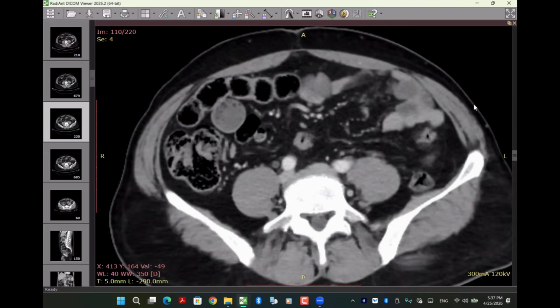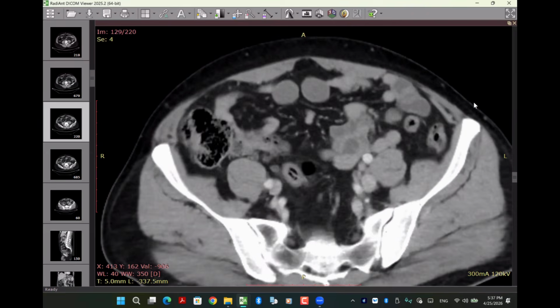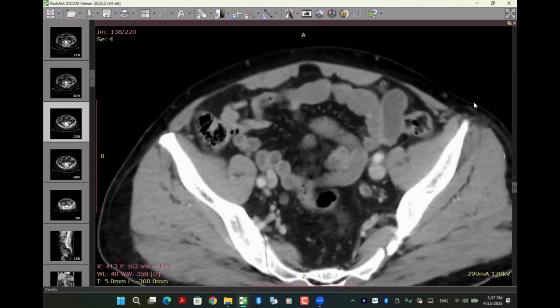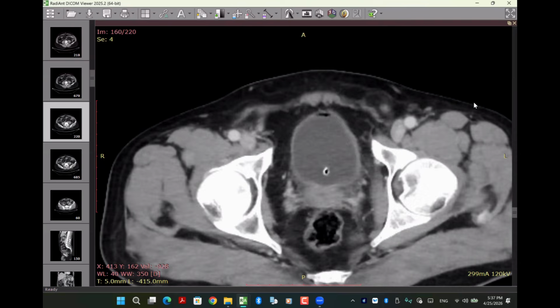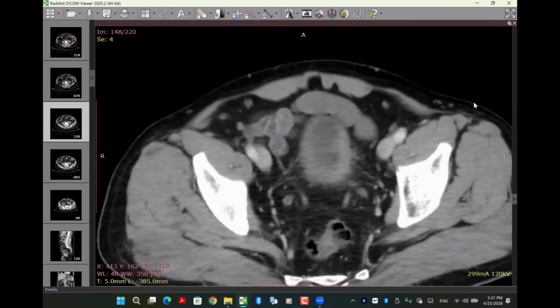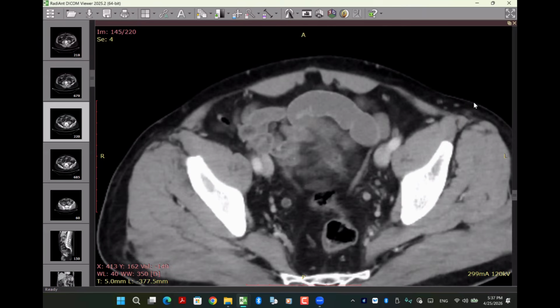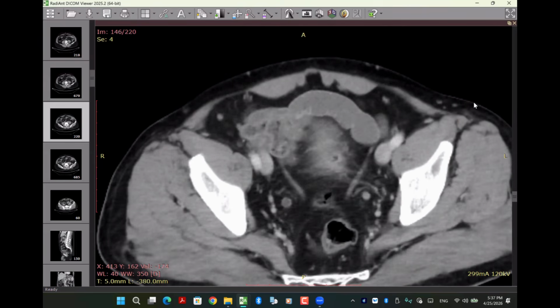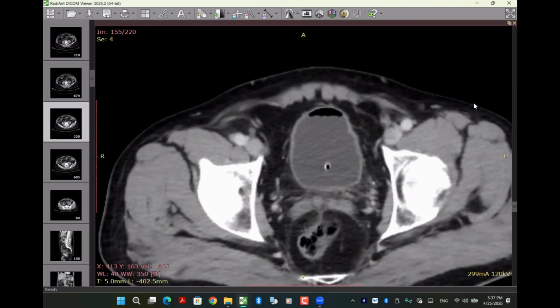Candidate number 13, can you please raise your voice more? The ureters appear to be dilated, and I'm looking for any mass in the urinary bladder. I could not see any mass in the urinary bladder. The urinary bladder was thick walled, especially on the lateral aspect. So this needs a cystoscopic examination to exclude any early bladder tumor.